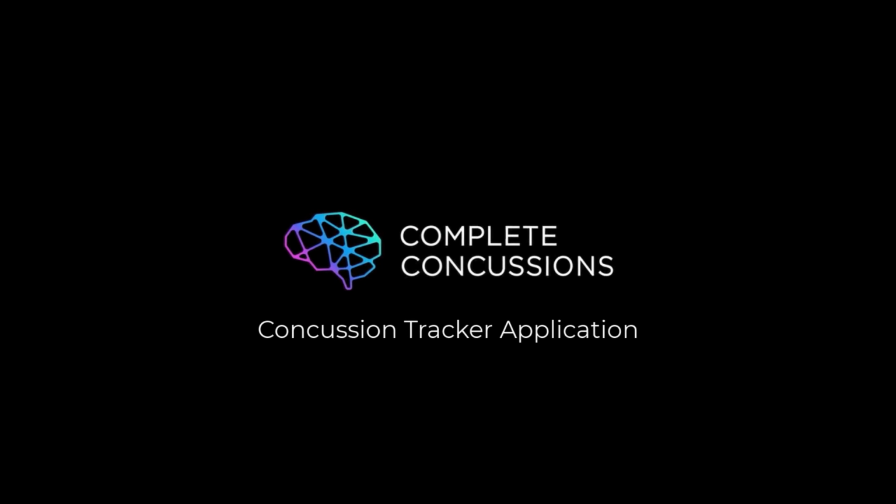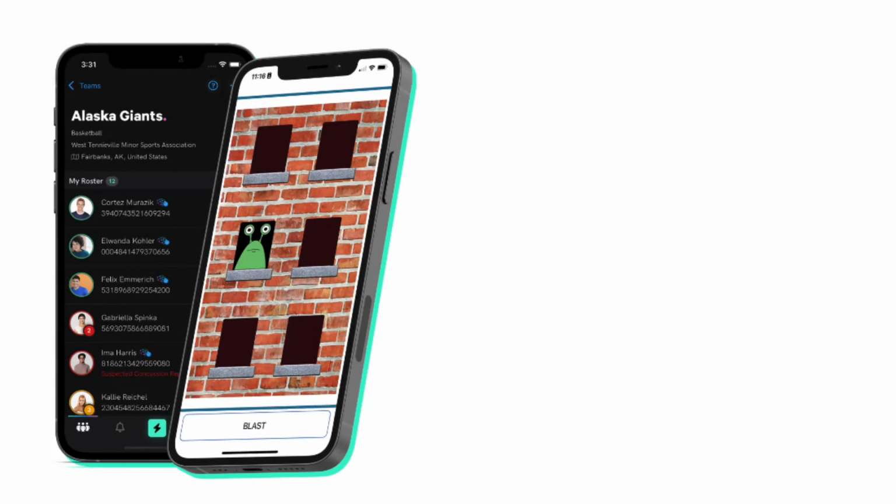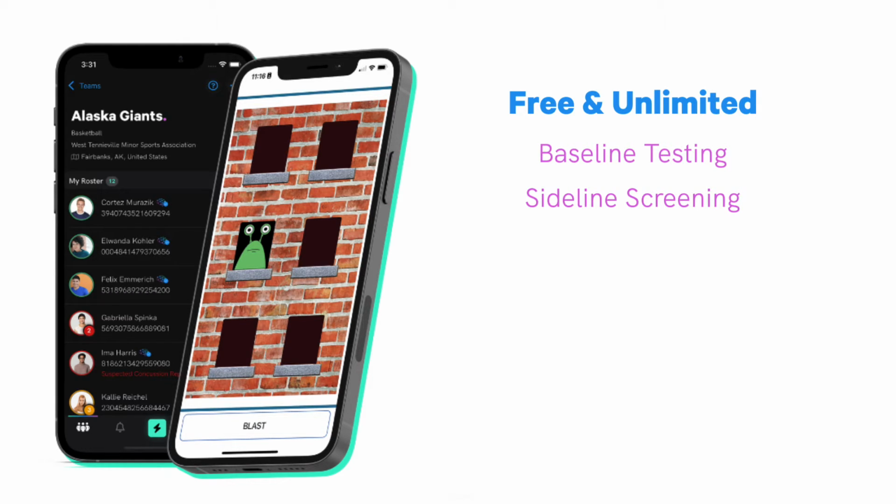Welcome to this quick video demonstration of the Concussion Tracker app from Complete Concussions. This application allows any coach, parent volunteer, or athletic trainer to run free and unlimited baseline concussion testing, as well as sideline injury assessments using a comprehensive battery of the best concussion tests available.